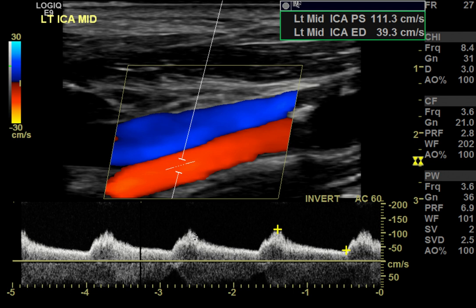In this particular case here, we're thinking, okay, it's in both carotid arteries, so it's something that's in common proximal to the carotid arteries. This ended up being a case of aortic stenosis. This patient had aortic stenosis that led to these waveforms in the carotid and vertebral arteries. So just make sure to take a look and see whether there's a delayed upstroke. If there is a delayed upstroke, think a more proximal stenosis.